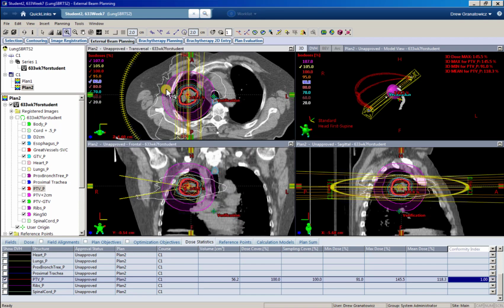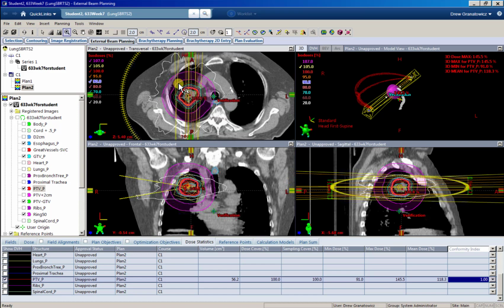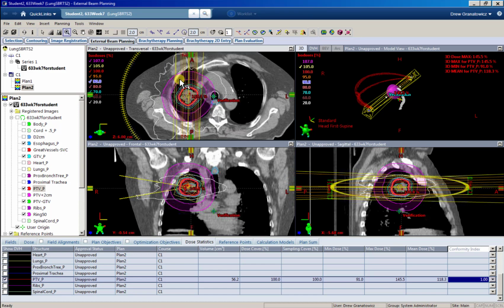All right. Last thing, if we look at, let's say, a 20% isodose line, you can see what it looks like here, right? It's fairly compact around our target. That's what we want. If you did not do the couch kicks, you would see that 20 line go all the way to the exterior of the patient. Those arcs would be in the same plane. That dose would just add up from each arc, right? Here we're splitting it up into two different planes, spreading that dose out.